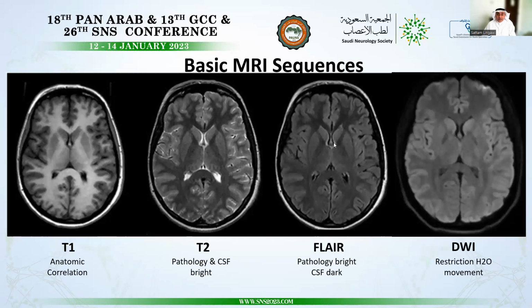The low signal intensity of the fluid within the ventricles and the subarachnoid spaces on FLAIR gives it the advantage of identifying subtle lesions abutting these spaces, meaning periventricular and subcortical areas, which we often need to identify subtle demyelinating processes, such as in MS.